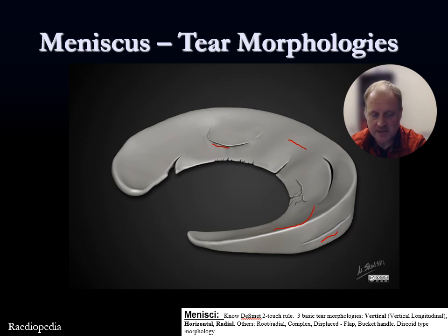This is a radial tear. That will also appear as a vertical line on MRI image, and I'll show you what that looks like. This is what's called a parrot beak tear. It's kind of an obliquely oriented tear that starts on the radial aspect and then makes a turn into more longitudinal. Here's some meniscal free edge fraying. Here's some complex tear. So just many different morphologies of tear that are all nicely shown on one schematic image.